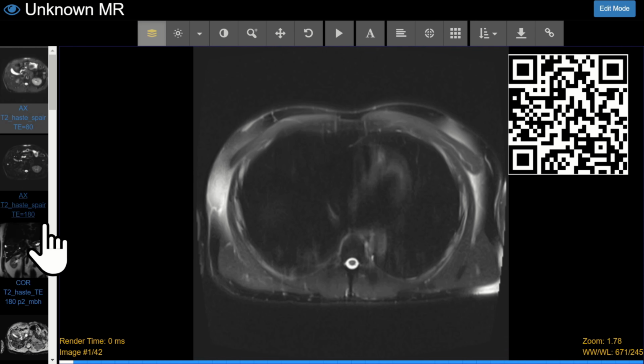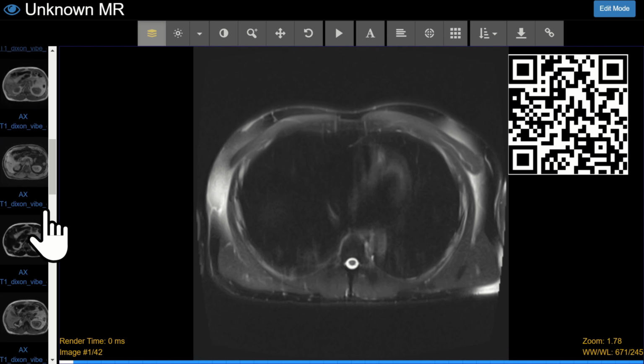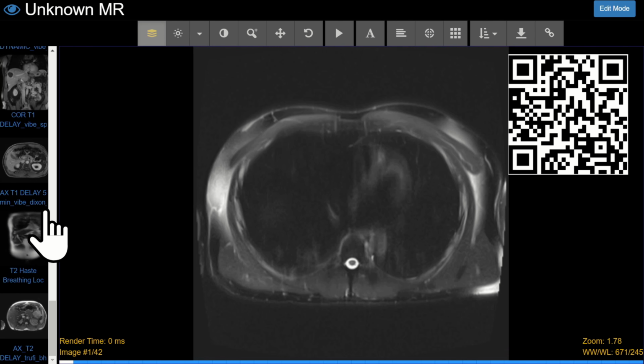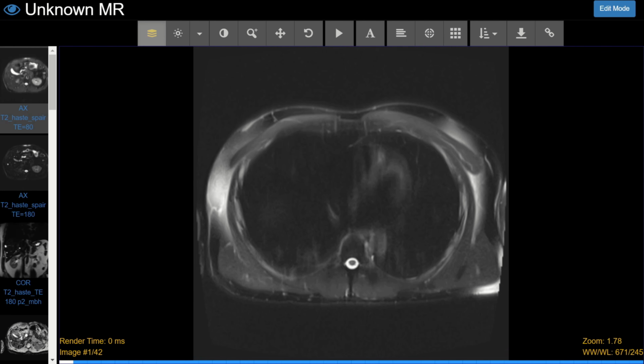So on the left here, we have all of the MRI sequences that are part of this routine liver MRI protocol. Scrolling through and looking at all these sequences, it can be a little bit overwhelming at first, but if we break it down, it's really not that bad. There are 4 groups that we can put each of these sequences in. And as we go through each sequence, we'll pay special attention to the appearance of the normal liver and what we use each sequence for.